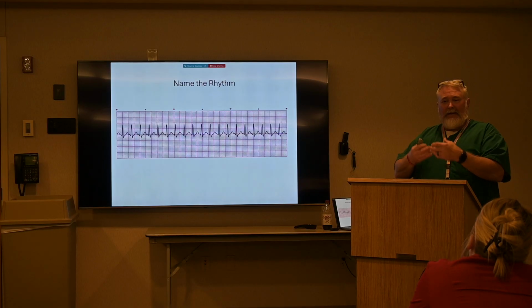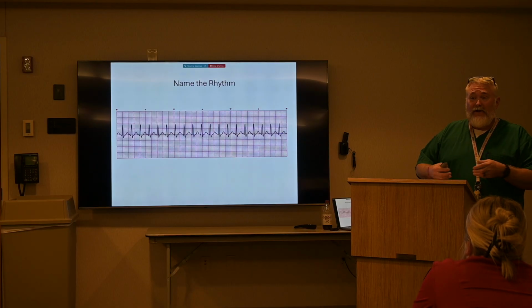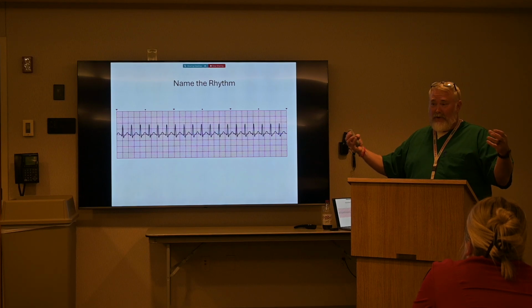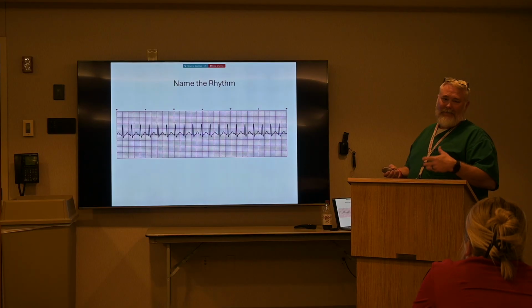What happens is adenosine will pull out the intrinsic rhythm of what's actually going on, so you can see, are there P waves, is there a PR interval? It slows it down long enough that you can see that before it goes back into the SVT rate. Sometimes adenosine will break it, sometimes it doesn't.